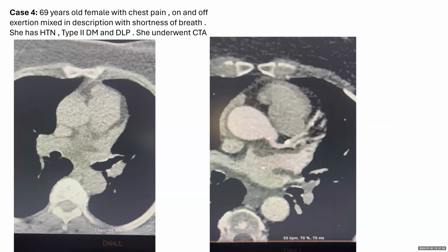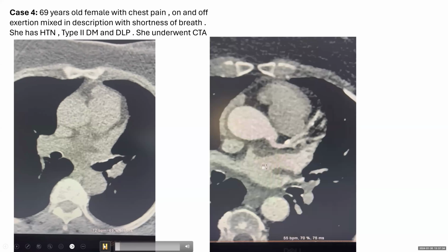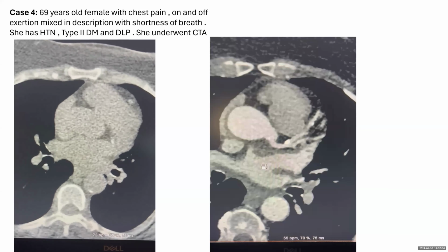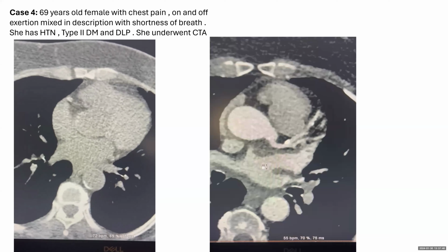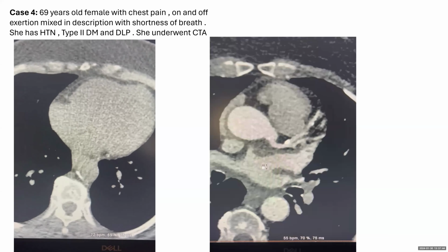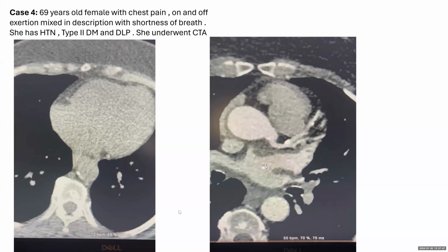The first one, which I would run now, is the coronary calcification sequence. Okay, and next, let's see what's going on with the calcification. I'll play it again.